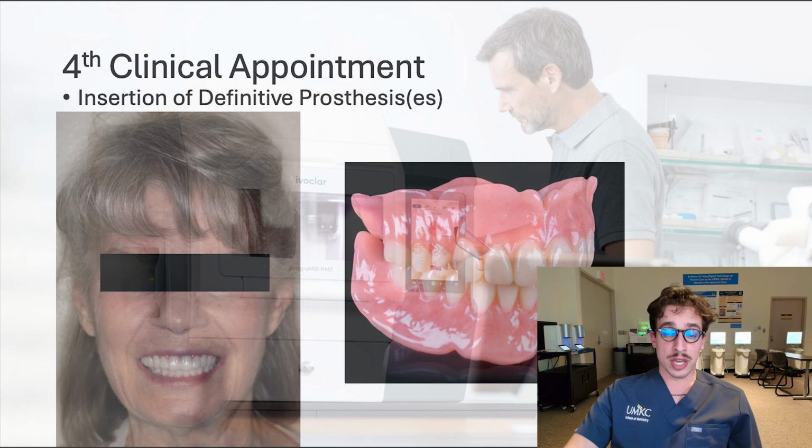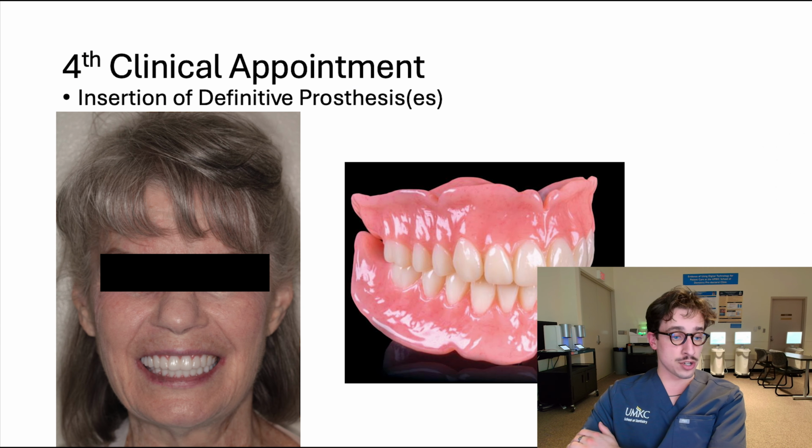So then what you'll get back from this is your final denture, which you'll then deliver for the patient. Again, you're delivering this in the same way you would a conventional denture. You're going to be trying it in, making whatever adjustments. You're going to do your 24 and 72-hour recalls.